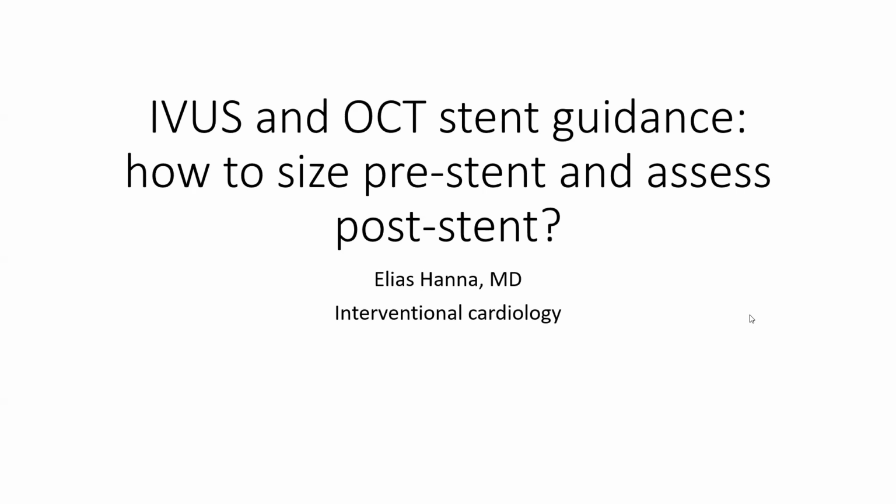There is more data and more push for the use of intravascular imaging to guide stenting, but few explain exactly how you do the measurements before and after stenting and what your endpoints are. I will try to explain that in detail, and I will explain some pitfalls, including pitfalls of the recently published Illumin IV OCT trial.